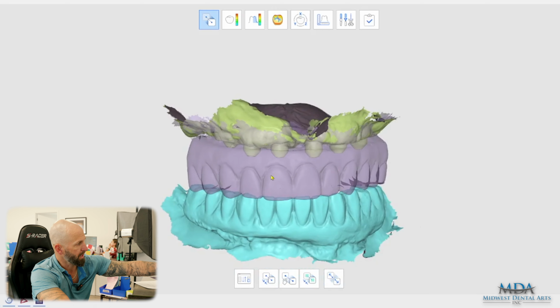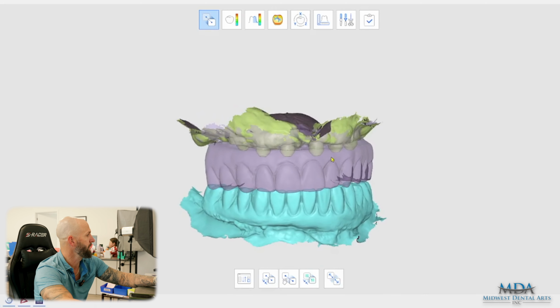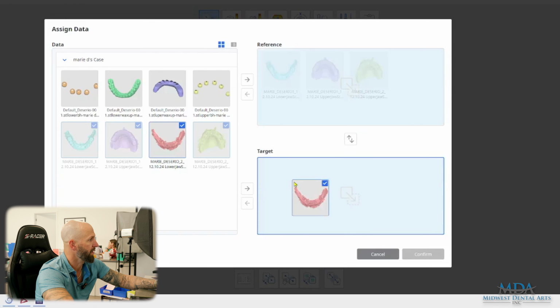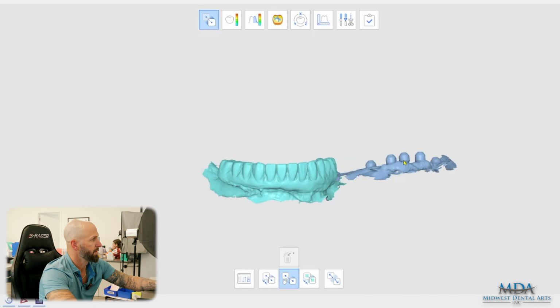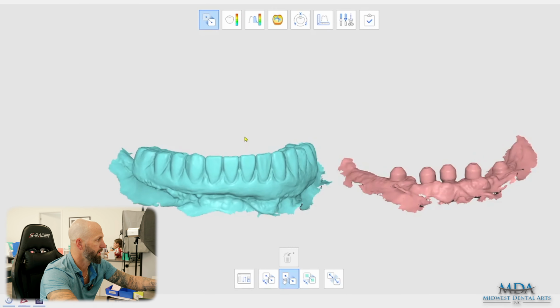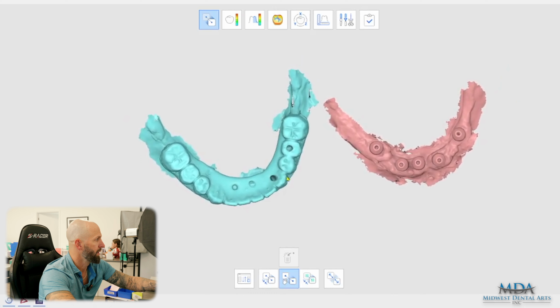Again, one of the common mistakes is that they scan the lower temp as a restorative dentist would be scanning, or the assistant, and they don't capture enough tissue. In this case, we've got a lot of tissue. We've got good tissue scans of the lower, and we're going to drag this to the side. And again, we can go with a 3-point alignment. So I'm looking at landmarks.